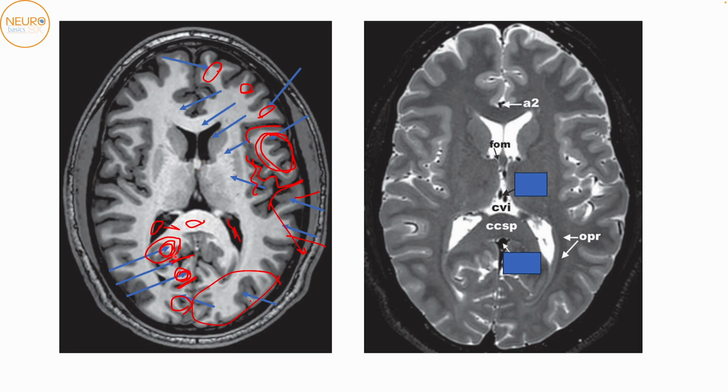Okay. Another structure you can pick up on over here is the foramen of Monro, the place where the frontal horn would open into the third ventricle. These slightly hypointense structures are basically the fornix, the anterior columns of the fornix. Okay, and this here is the genu of the corpus callosum. And this region.